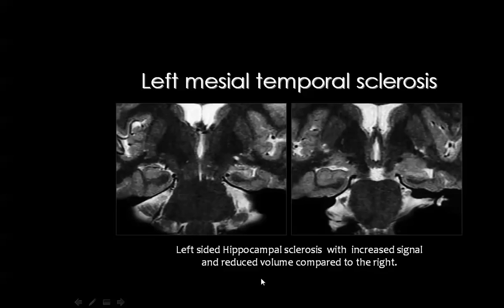These findings are usually diagnostic of mesial temporal sclerosis, and they represent a good explanation for the complaint of the patient of seizures.